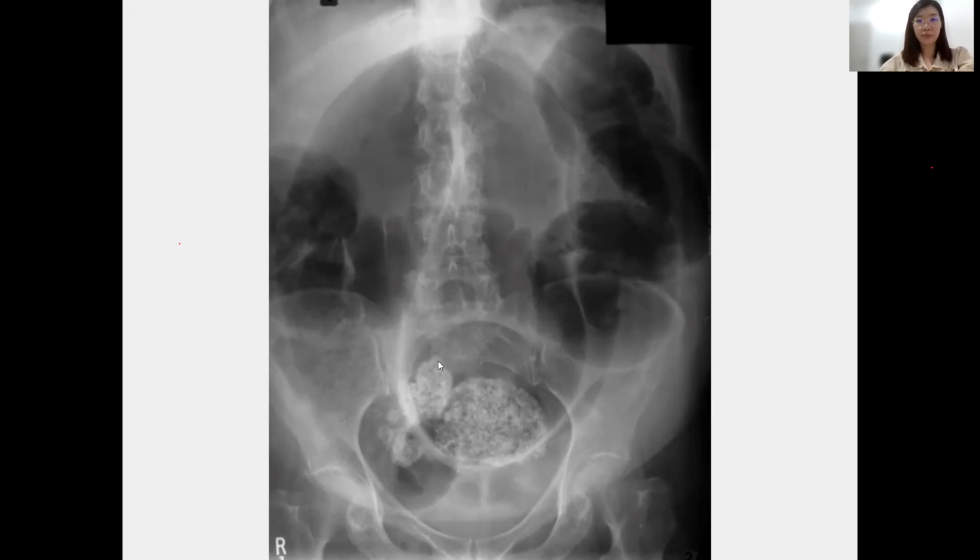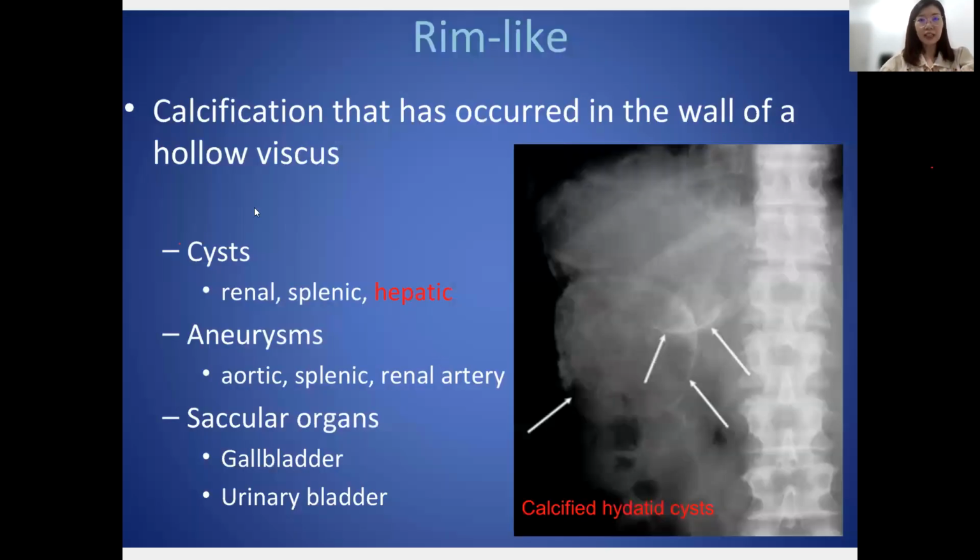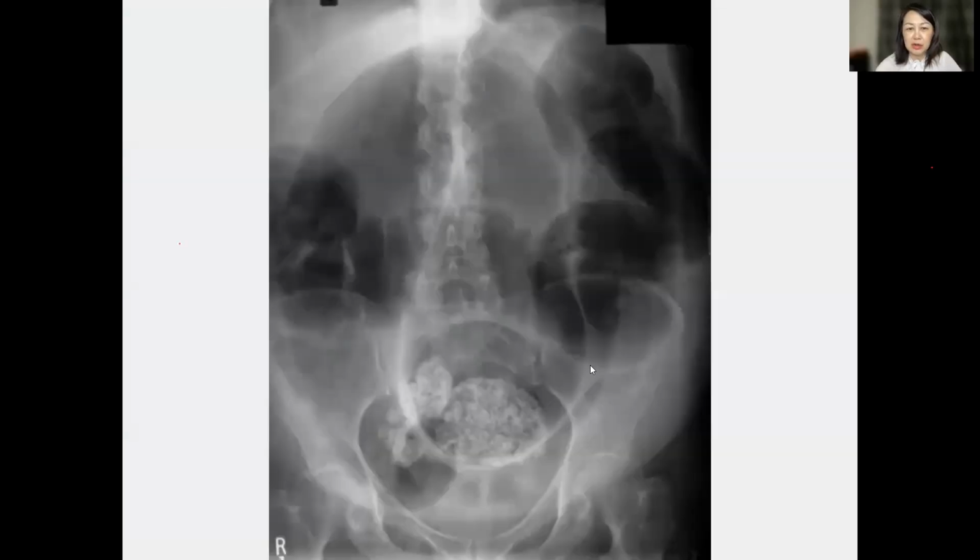These are emergency. Okay. Why is the thing in the middle? This one? Yeah, this one, fecal material. Oh, I see. Okay, fecal material like this, like gauze, like that.